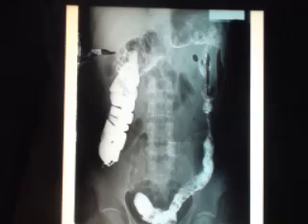Another example for colonic polyps, you have to write a good comment about this. You can see here barium enema showing multiple filling defects affecting the rectum, sigmoid colon, and transverse colon, and it's mostly colonic polyps. They are multiple and innumerable, so it's mostly due to FAP.